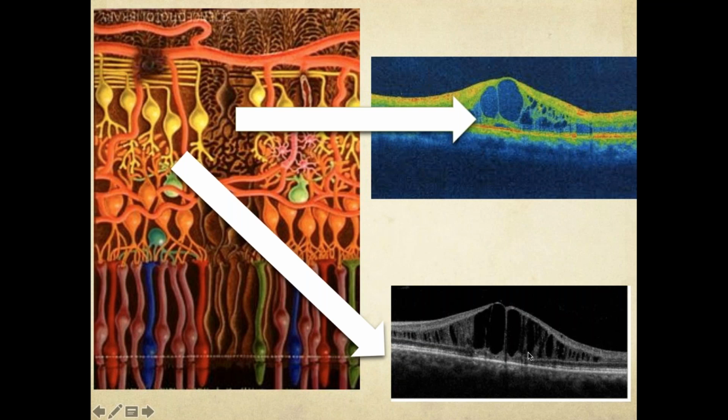And multiple splittings between the two hyperreflective bands. Hyperreflective bands are split completely. Very poor prognosis. Here, although splitting is there, they are taking various courses. Still some amount of communication is maintained. So this will likely have a better prognosis.